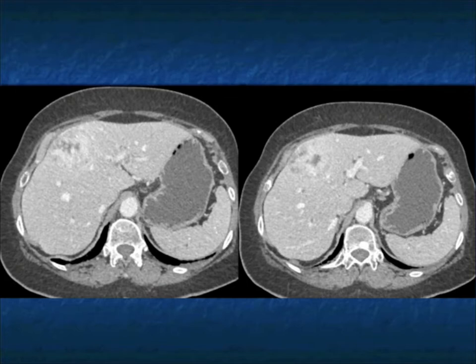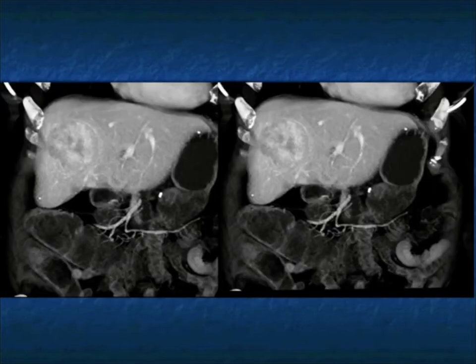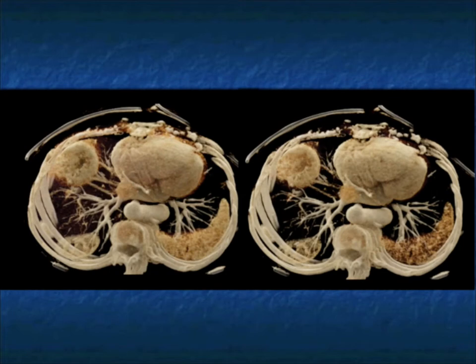You can see on the venous phase, the lesion is still seen, but it's becoming close to isodense. Again, the extent of the tumor is best seen in the arterial phase, but you can see how the lesion washes out. But if you saw it here, with a scar, you might even think about a hepatic adenoma. You might think about a few different things, even cholangiocarcinoma. So that arterial phase becomes very, very important. On the venous phase, we do appreciate the pseudocapsule, and the 3D mapping, in this case with volume rendering, can be very valuable.